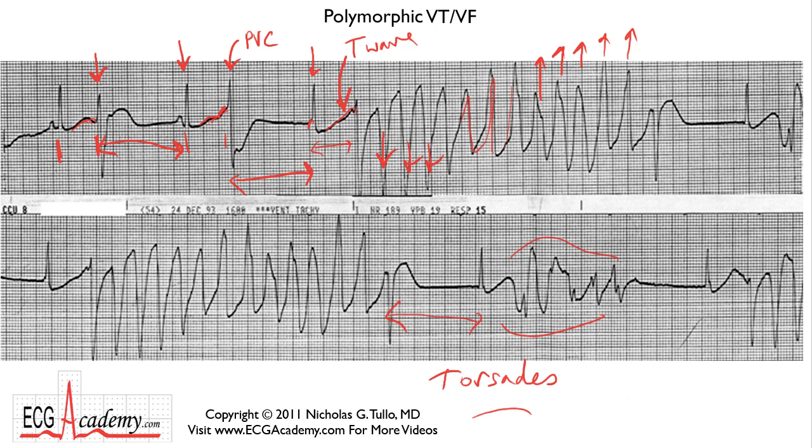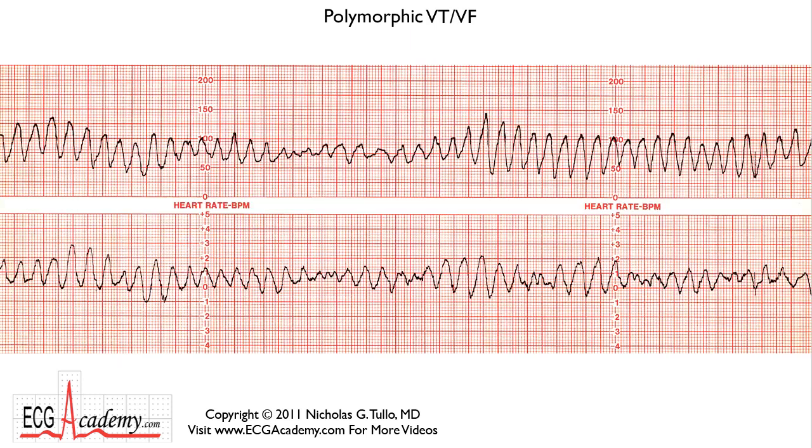The last arrhythmia I want to show you in this section is this, and I think this strikes fear in the hearts of men and women on the telemetry unit. It's ventricular fibrillation. It's ventricular fibrillation because it's polymorphic and it's at a very rapid rate. You can see over here, clearly rates faster than 300 beats per minute. And here, it's almost like the QRS complexes seem to disappear. Where's the QRS? It's almost just like noise here. So that's pretty characteristic of ventricular fibrillation as well.